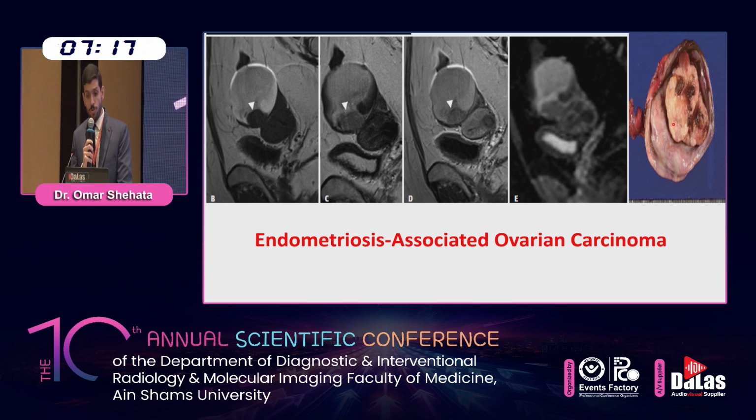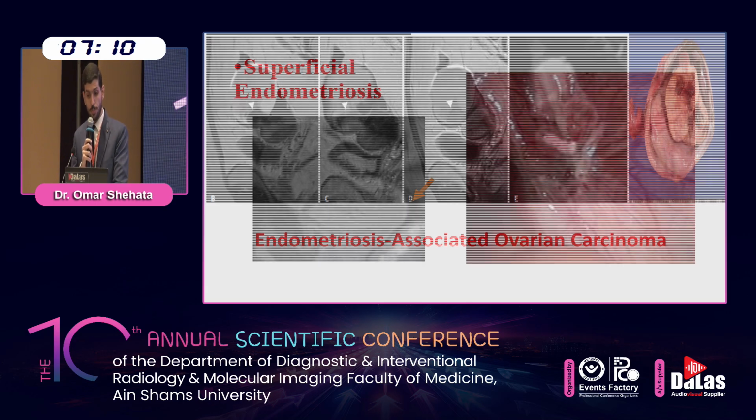The last image shows surgery has been performed. The mass has been resected and pathologically diagnosed as clear cell carcinoma.